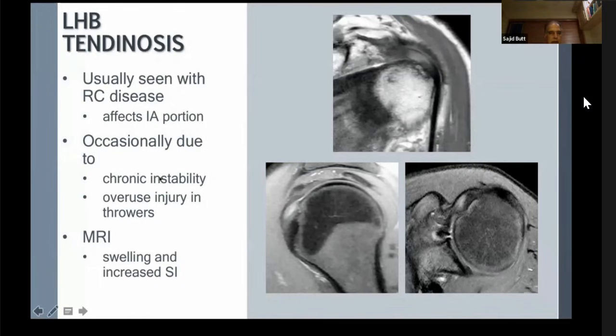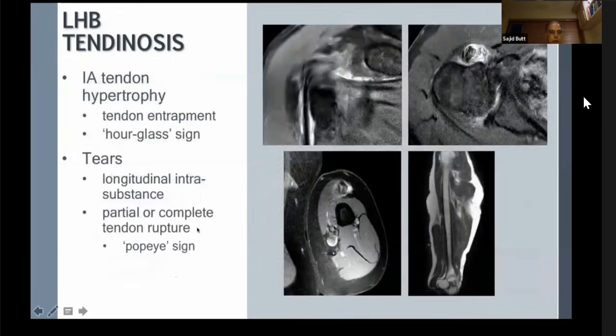You get to see that in patients with overuse injury, in throwers, javelin throwers, ball throwers, basketball players. Excessive thickening of the tendon with swelling of the tendon contour. Another example, coronal imaging again, biceps tendon, notice how thickened it becomes just because of chronic friction present around here.